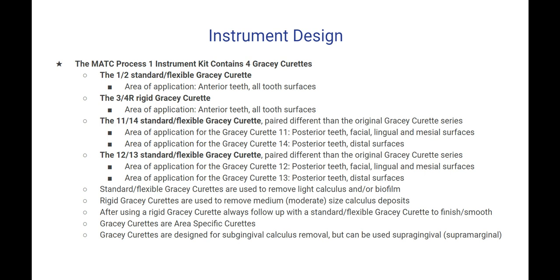The 11-14 standard flexible Gracey Curette is paired different than the original Gracey series. Area of application for the Gracey Curette number 11, the posterior teeth, facial, lingual, and mesial surfaces. Area of application for the Gracey Curette 14, posterior teeth, distal surfaces.